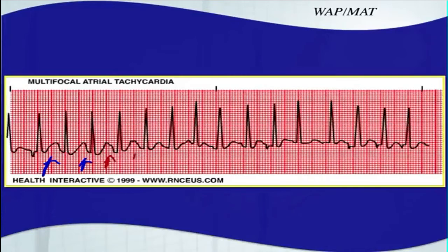We talked about that before. The same thing happens here. It's in that T wave. That's that extra bump. It happens over here too. That little bump is the P wave. And the fact that this is so irregular indicates that this is possibly a multifocal atrial tachycardia.